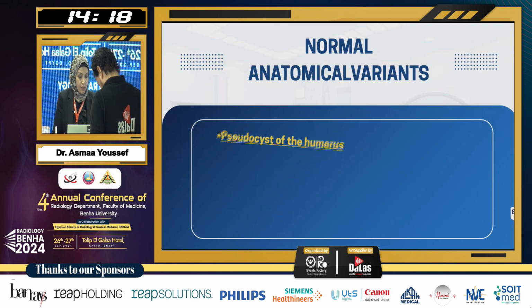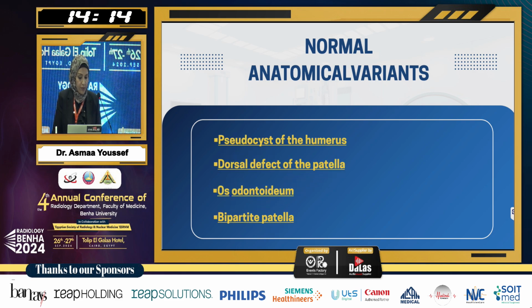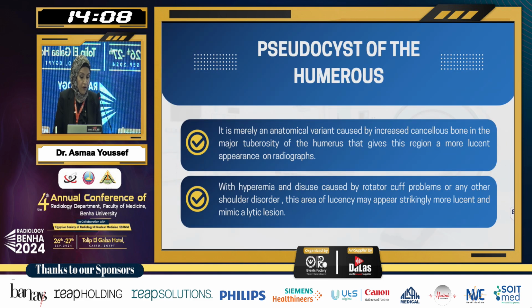First category is normal anatomical variant, like pseudocyst of the humerus, dorsal defect of the patella, os odontoideum, and the bipartite patella. Pseudocyst of the humerus is merely an anatomical variant caused by increased cancellous bone in the greater tuberosity of the humerus that gives the region a more lucent appearance on radiograph. With hyperemia and disuse caused by rotator cuff problem or any other shoulder abnormality, this area of lucency may appear strikingly more lucent and mimic a lytic lesion.